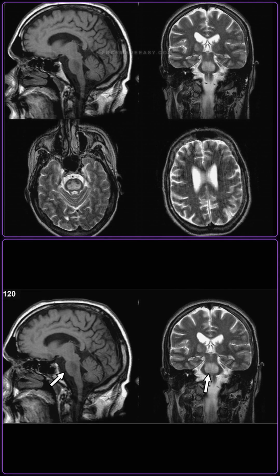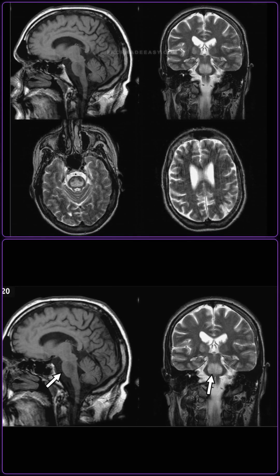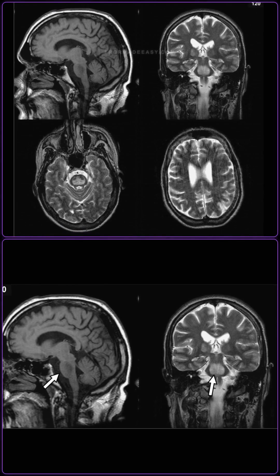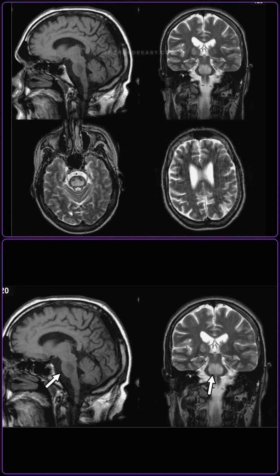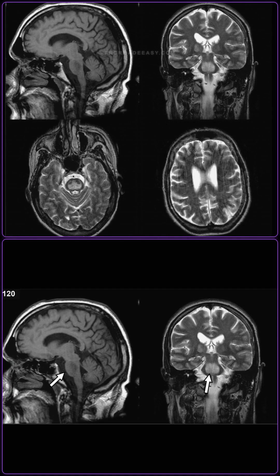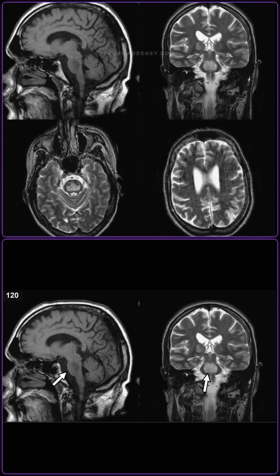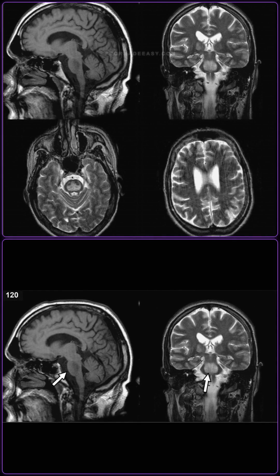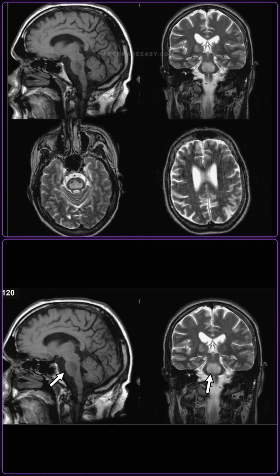Standard MR or CT imaging can be normal for up to 14 days after symptom onset, lagging significantly behind the clinical picture. However, diffusion-weighted imaging is extremely sensitive, showing restricted diffusion in the central pons within 24 hours. Although most commonly confined to the pons, extrapontine myelinolysis can also occur, affecting the basal ganglia, thalamus, and subcortical white matter. What are the immediate management steps?